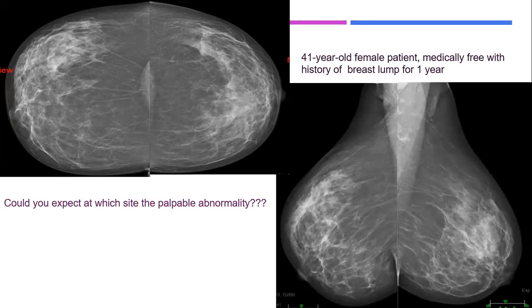Can you appreciate it on the MLO now? Still difficult. Why is it difficult? Because of the breast parenchyma. Look at the MLO.